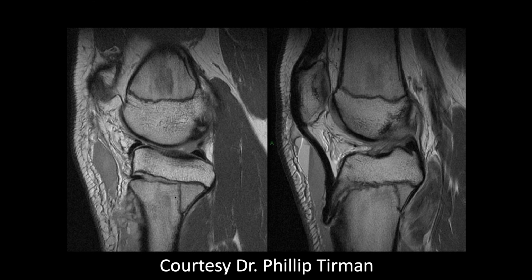Epiphyseal injuries are like that. They can prematurely close at any level. 1, 2, 3, 4, 5 is just more common in 5 and 4 and 3, but you can have a premature closure on 1.